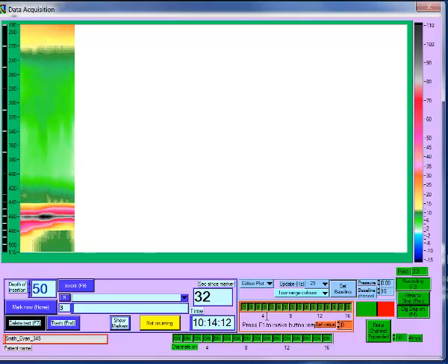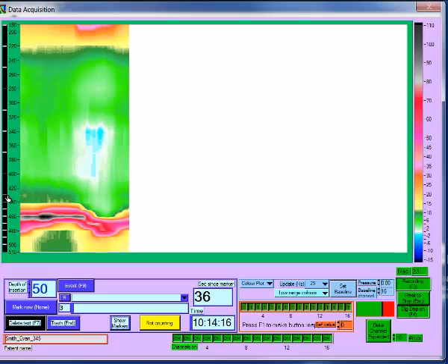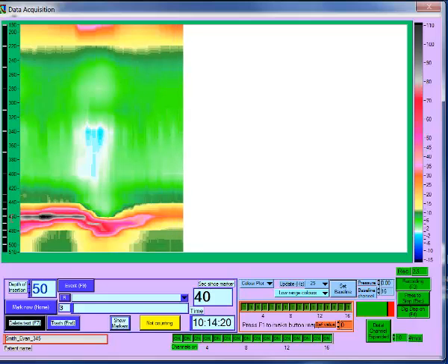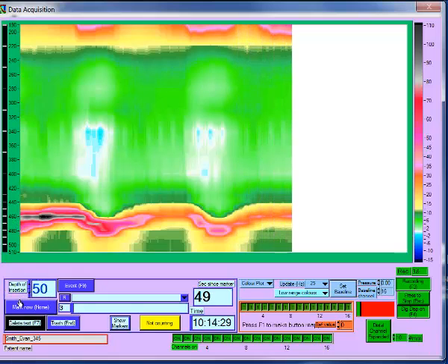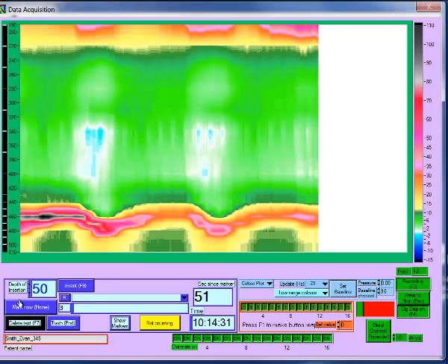In this display, there is a graphical representation of the position of the recording points on the manometric catheter on the left, and the scale displays the distance of each point from the nose, assuming that the depth of insertion control is correct.